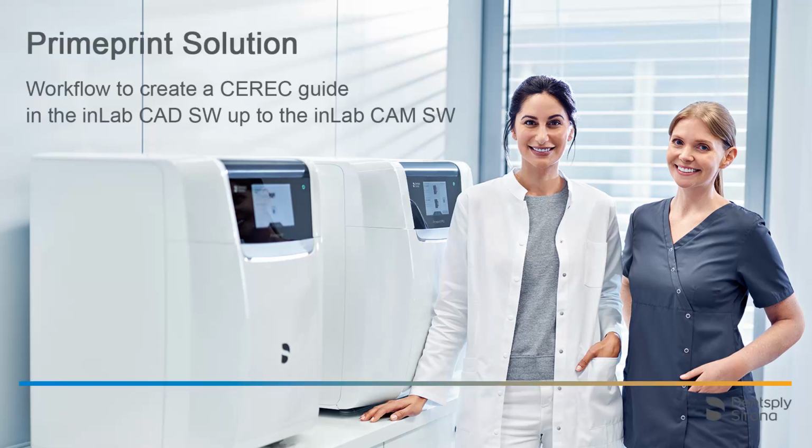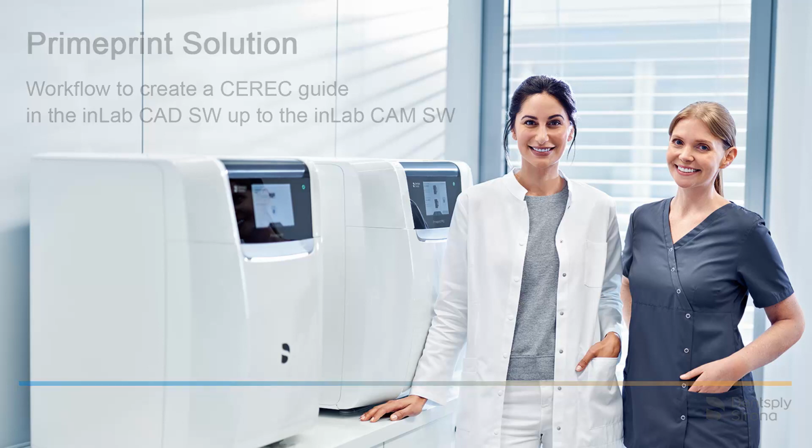Welcome to this video tutorial on the topic of Primeprint Solution. In this video, we will demonstrate the workflow of creating a CEREC guide. We will run through the inLab CAD software up to the inLab CAM software.